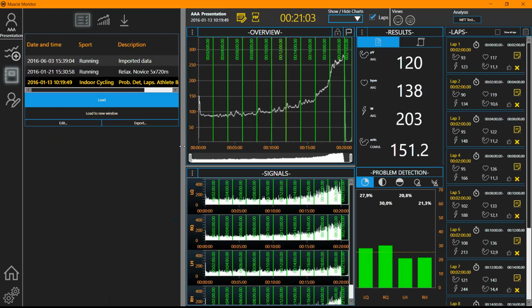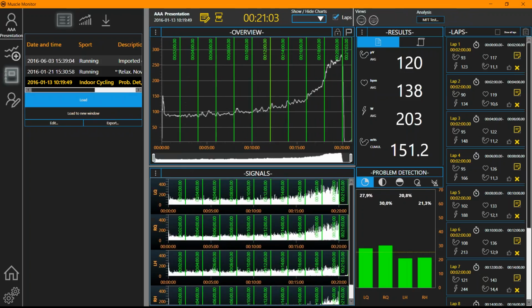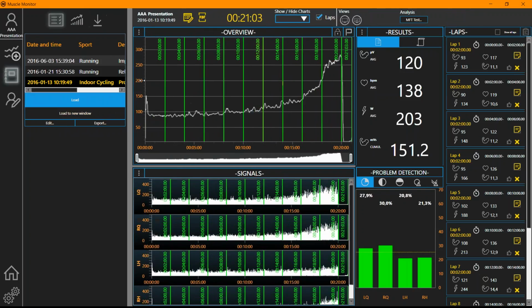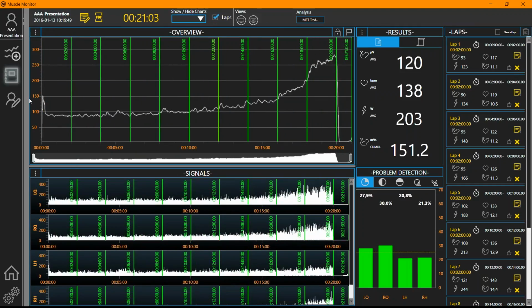Some changes to the charts and controls, how this can be opened up. So I could pop this measurement totally to a new window, so I wouldn't have any of these side frames. But we can open it to the same window and slide these to make more room, or I can double click it. So I can use most of the screen for this measurement.